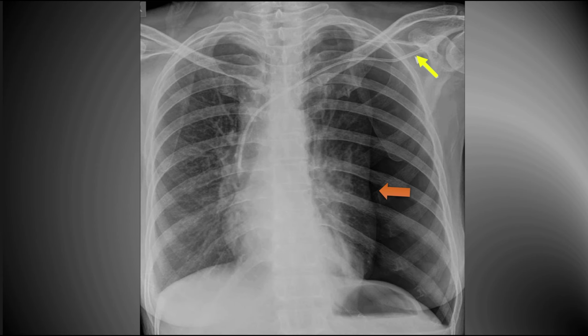Now let's move on to feeding tubes. Virtually all critical care patients will have a nasogastric tube placed in to either drain the stomach or feed the stomach or deliver medicines, or all of the above. It is not easy to place such a tube in an intubated, uncooperative patient, and not infrequently these tubes are placed in the wrong location.